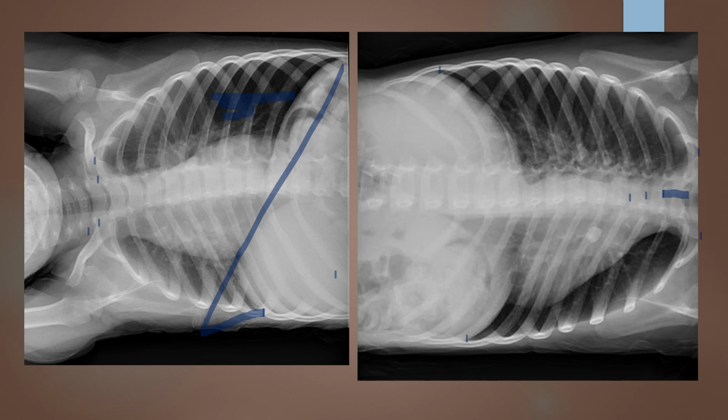If this is my patient's right side, the spinous processes are actually towards that right side, meaning if my patient was in AP projection, they were rotated slightly LPO. We can also follow that up by looking at the lung fields, which do not look quite as symmetric side to side. So we have a little bit of mid-coronal plane rotation on this one. This one looks pretty good.